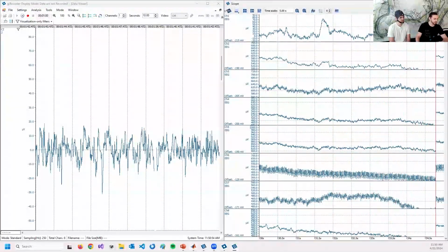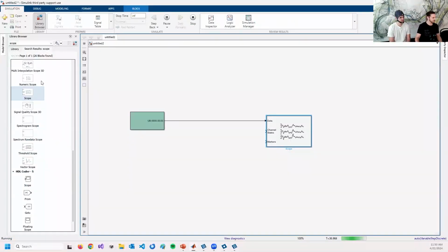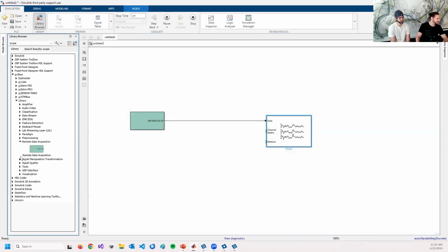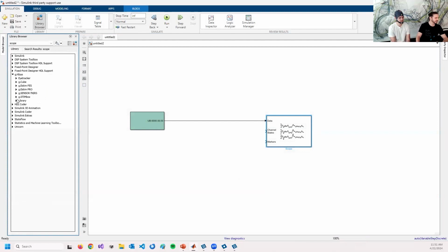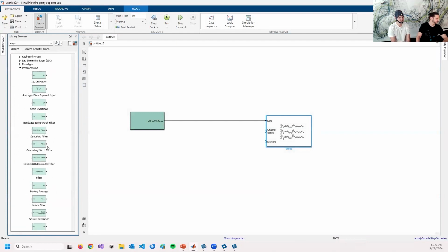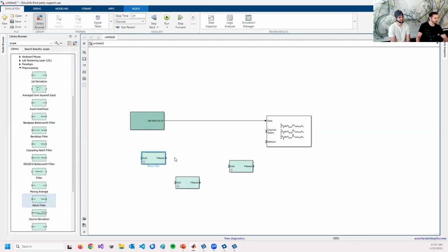And now we could, again, do some pre-processing in g.tec. So we can look at some more specific features that would be interesting for our research use case, for instance. So again, I would go to the g.tec library, and I'd like to apply some pre-processing filters. Therefore, I'd add some Butterworth filters again for notch and for bandpass.